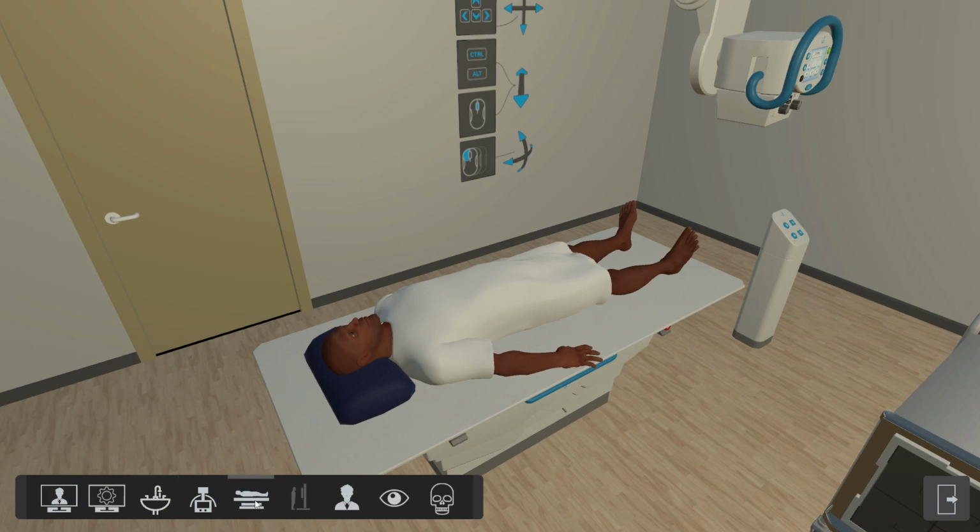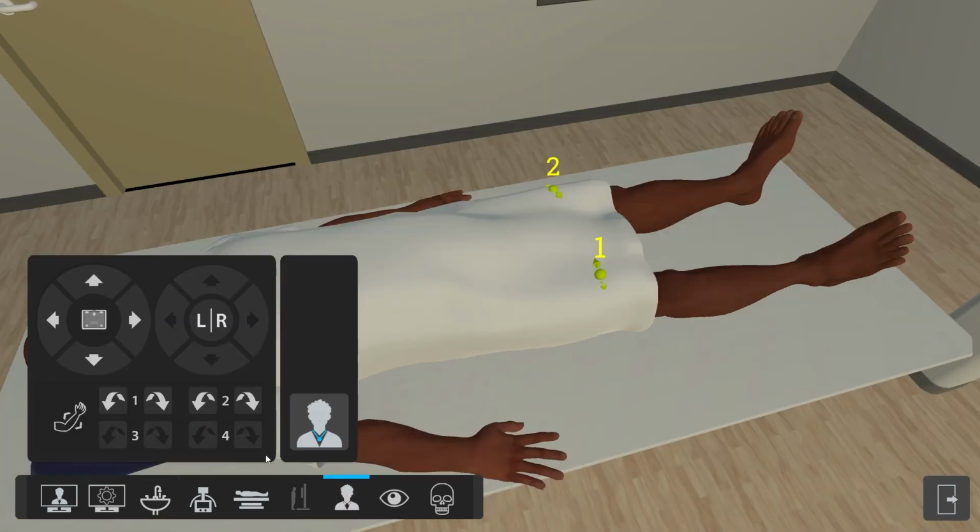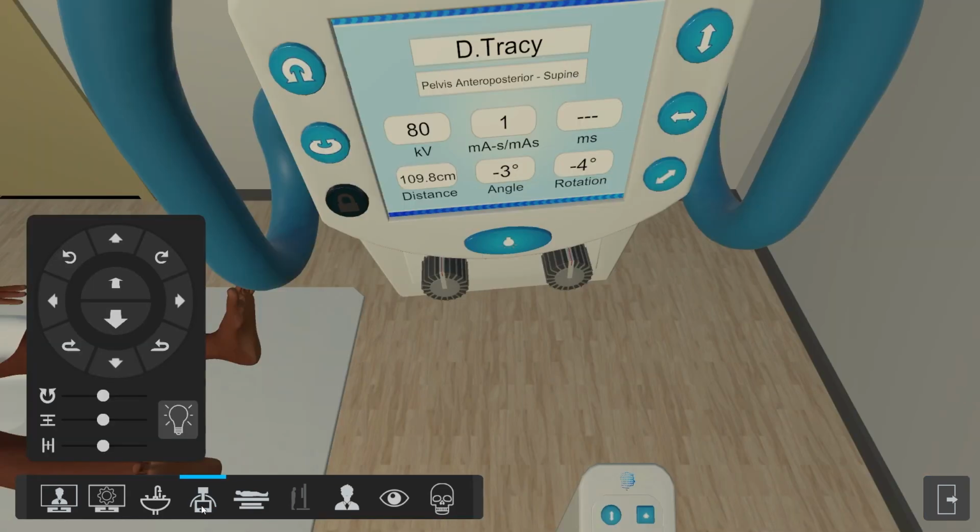Another way to check is by going into this table icon, and this blue arrow indicates that it's out, and that other blue arrow facing in indicates it's in. I can of course check by dragging it out, and then I'll be able to see it.